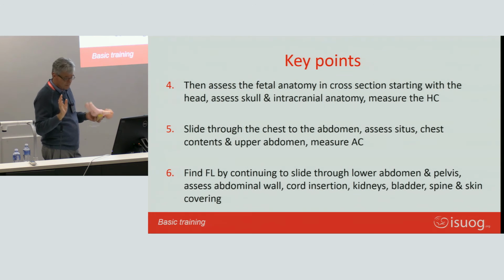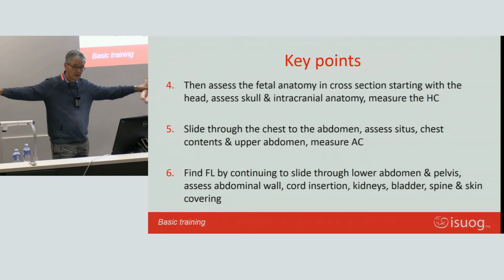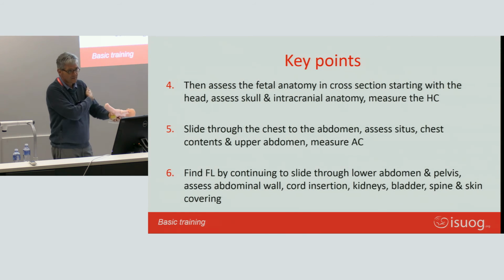And then, of course, the limbs, but that is a different topic. Then you get to the femur, and at 12 weeks you want to know 4 limbs, each with 3 elements, 3 long bones, and then bits and pieces added onto the end of it.